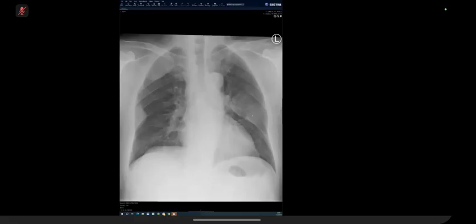So this further reaffirms my diagnosis of a sinister process of malignant pathology, likely mesothelioma, being the most common cause. Why the interest in mesothelioma? If I say the patient has no asbestos exposure and they are 35 years old? Well, the reason is when it goes into the medial part of the mediastinum, the paramediastinal lesion, and the lobulated appearance with the destructive bone changes, that would be my primary differential.